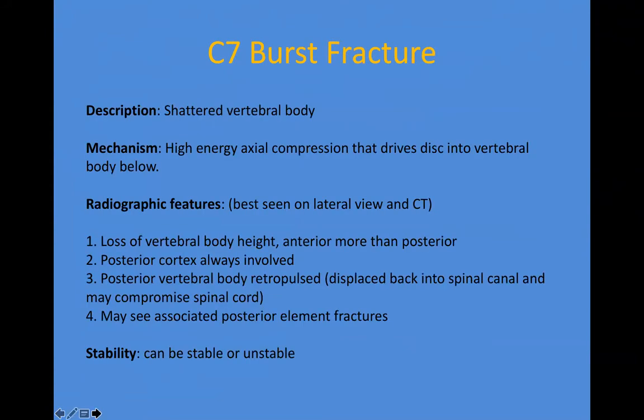Yes, meaning that axial compression can result in burst fractures and other injuries. But when you see a burst fracture, you know that at least there has been some component of axial loading. But for example, you could have a cervical spine injury that's axial loading plus some hyperflexion. So that may or may not be a pure burst fracture.